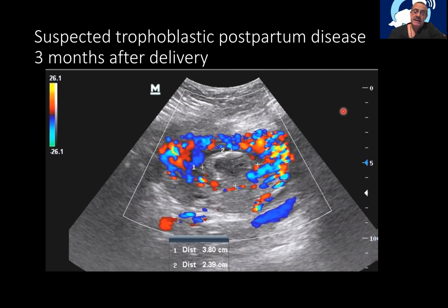A trophoblastic tumor of the placental site insertion. We're not supposed to be looking at something like that inside any uterus. That can even be a choriocarcinoma.